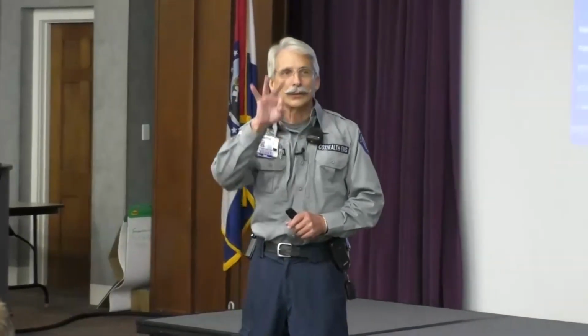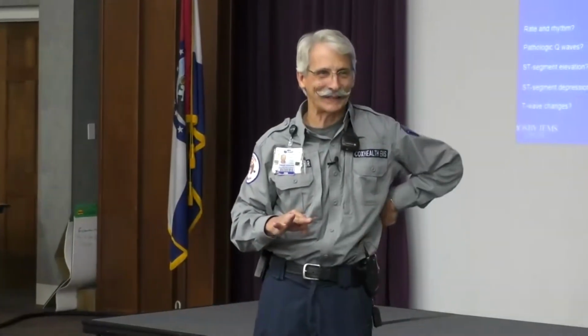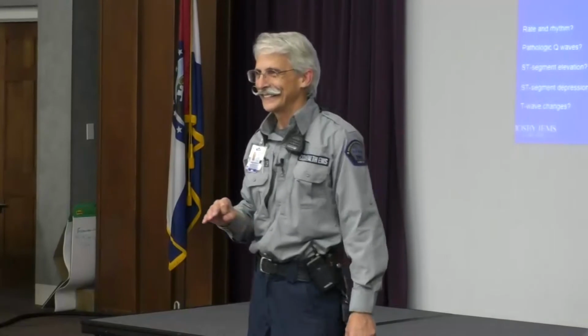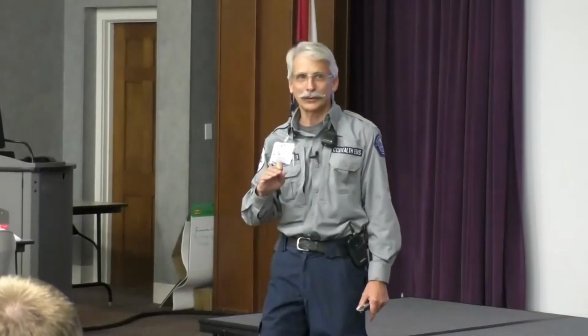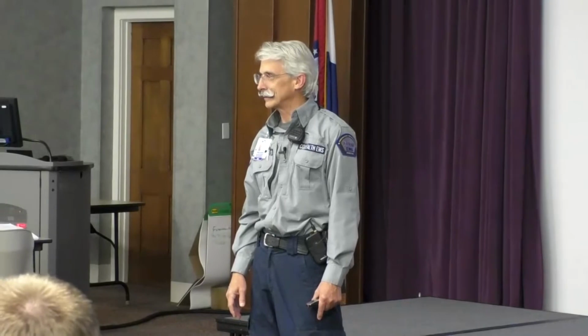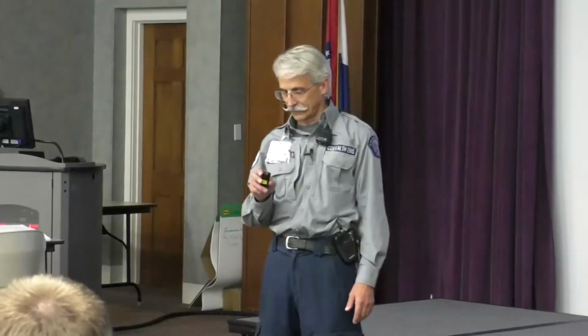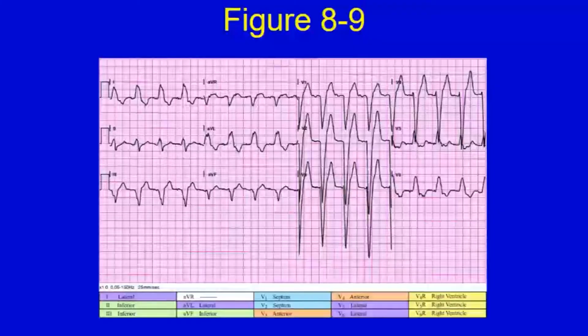Okay? 3 little boxes, 0.120 or 120 milliseconds. Boy, don't you love the metric system? Okay. So this is wide enough.